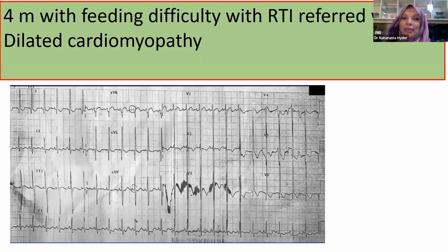And it is very important that I put it here, because most patients come with an echo of dilated cardiomyopathy, and if the echocardiographer misses something, the patient may be treated like viral myocarditis. But it will be a crime if we miss this ECG. In this ECG, we get a prominent Q wave in lead 1 and AVL, and also ST depression in V6. When an adult cardiologist finds this, they will say there is ischemia, and we know that coronary may be a cause.